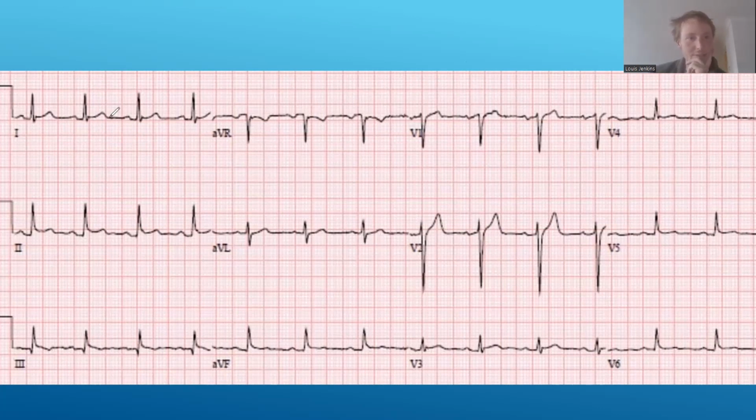Looking at our high lateral leads, we do have PQRST. We do have what looks like a little bit of PR segment depression. Now, this is something that's really hard to notice if you're not looking for it. But if this is our isoelectric line here, and if I can draw a straight line, which I can't, I really need to get one of those touchpad things.